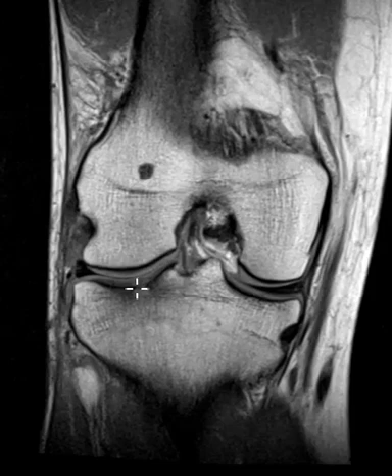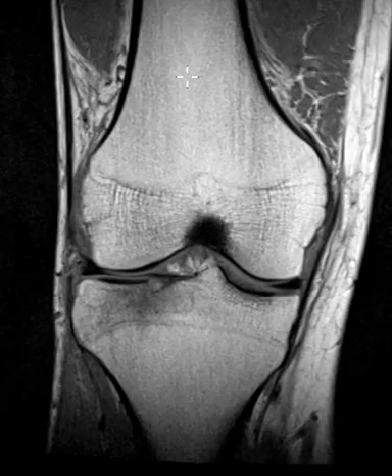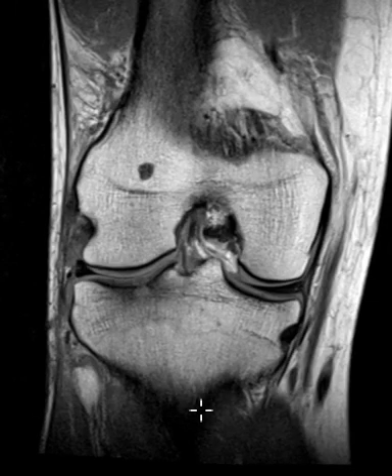But there's another thing down here beneath the tibial articular surface. So the femur is up top, tibia is down below. We see the tibial plateau right here. This dark band is the cortex, and the bone is eroded right through. The little bone lesion has eroded through the cortex.